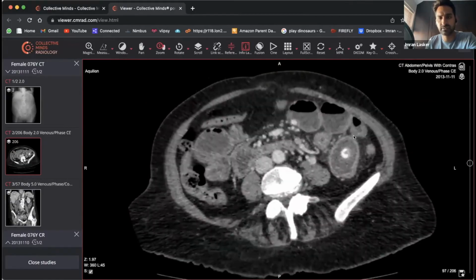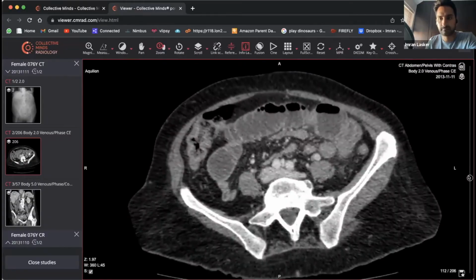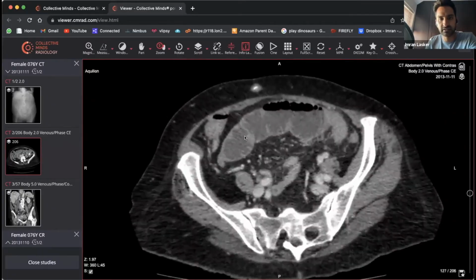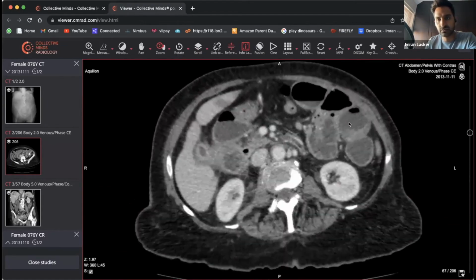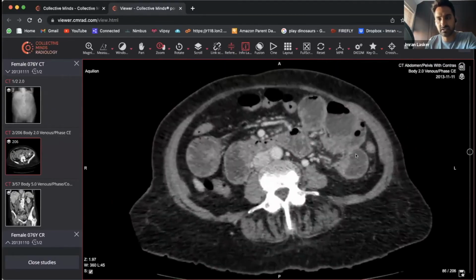Then you can see some hyperdense material there. Are we worried? It looks hyperdense, doesn't it? Then you scroll through that way. Your eyes are around somewhere here, and you're coming up to this region over here, maybe. I'm going to keep my mouse following. Look, that goes that way, all the way that way. We're coming up to this region over here, all the way. So we're going upwards, and it connects down here, coming all the way down.